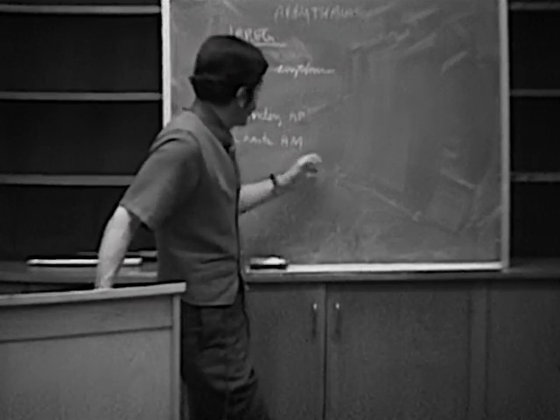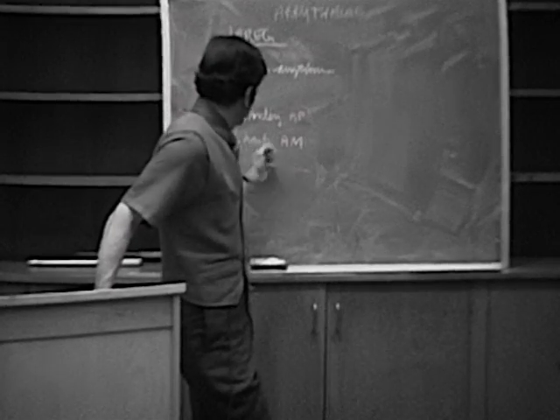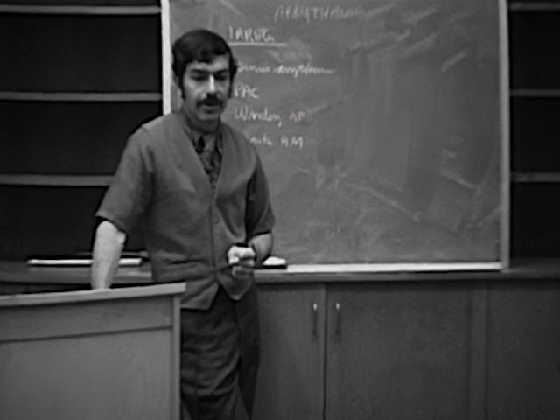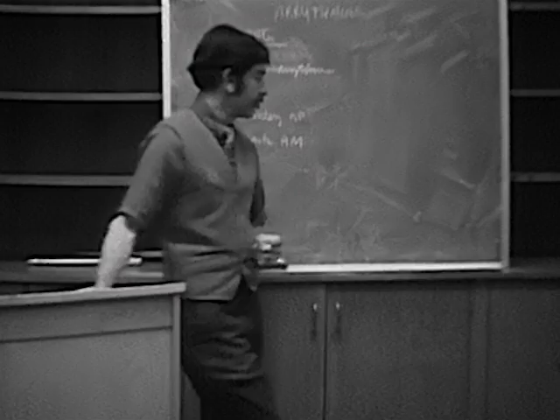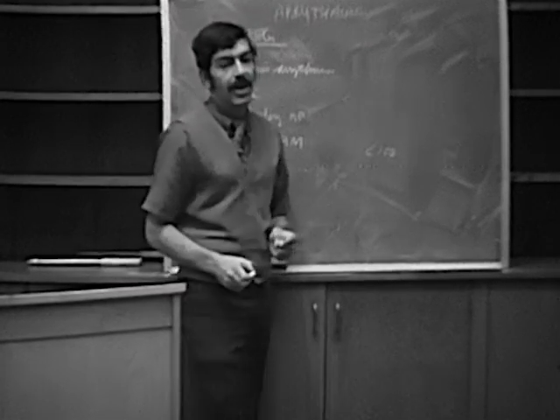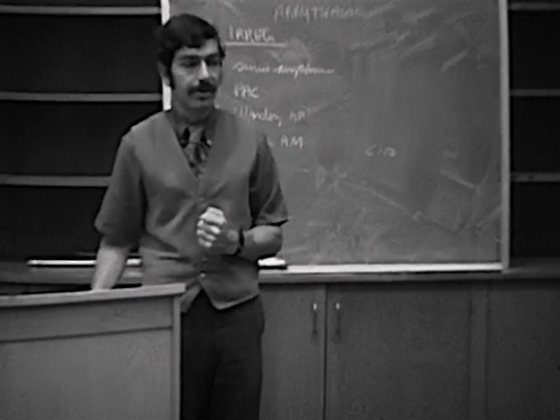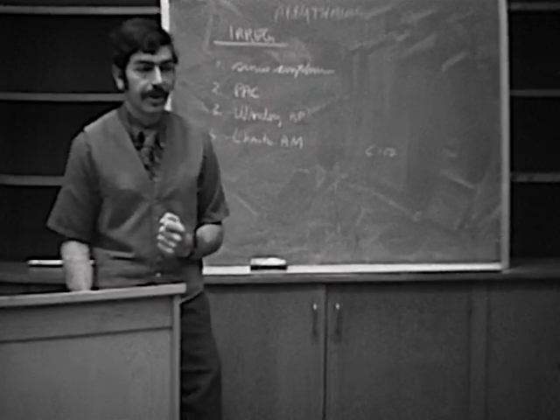But your ventricular rate is not very rapid as a result of this atrial irritability. You have a rate of less than 100. That's chaotic atrial mechanism, which is differentiated from chaotic atrial tachycardia, which is also called multifocal atrial tachycardia.